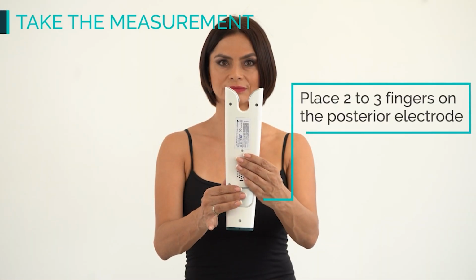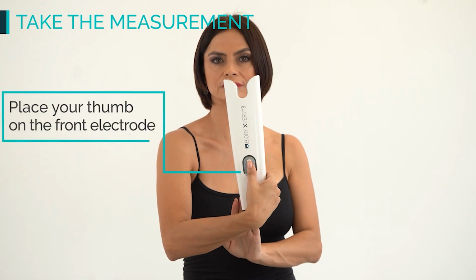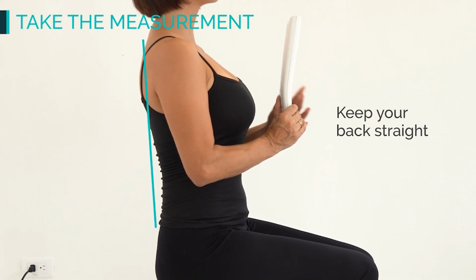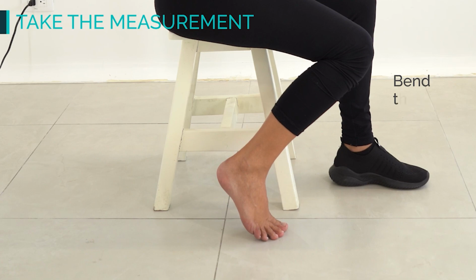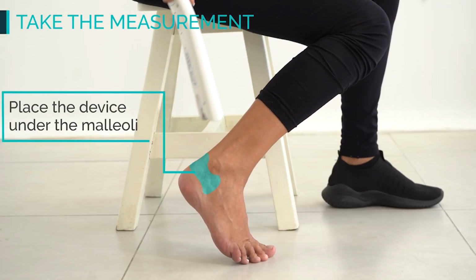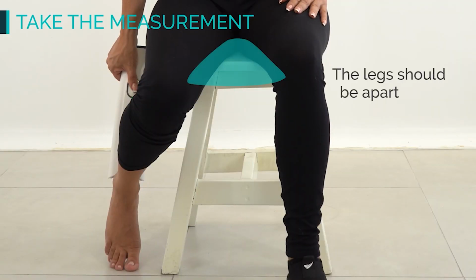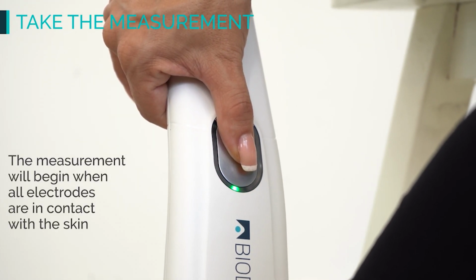Place 2 to 3 fingers on the back electrode and place your thumb on the front electrode. Keep your back straight during the measurement. Bend your leg and lift your heel. Position the device under your malleoli. Make sure your legs are spread apart. Don't move anymore. The measurement is going to start.